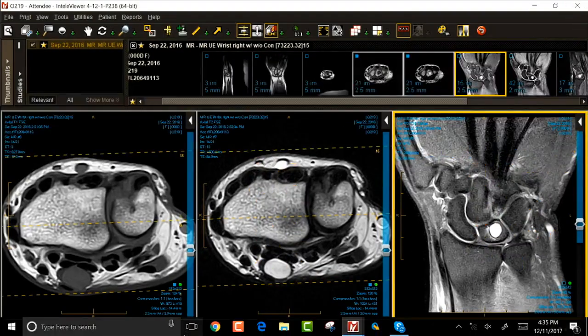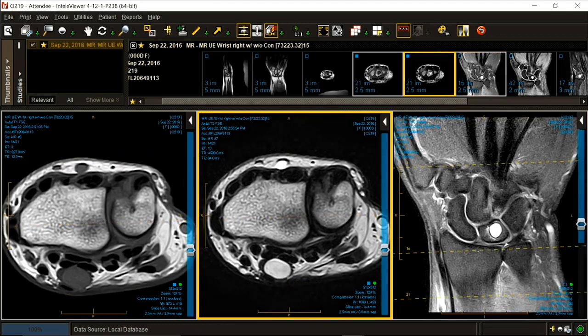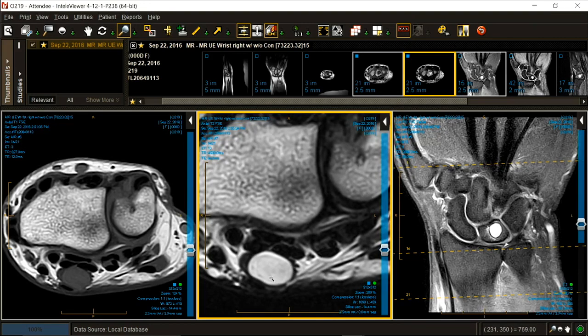Now that I've suitably entertained you and you have come up with a diagnosis, you might want to try the following maneuvers. It's well circumscribed. Agreed? It's round to oval. Agreed? Well, maybe not. Yeah, it is. How about the internal character of it? It's got a little bit of heterogeneity associated with it. T2 signal, not PD signal, not stir signal, T2.